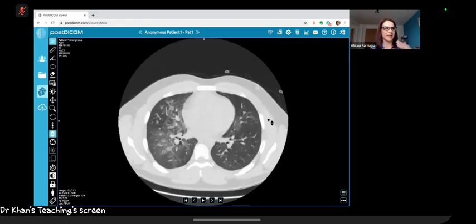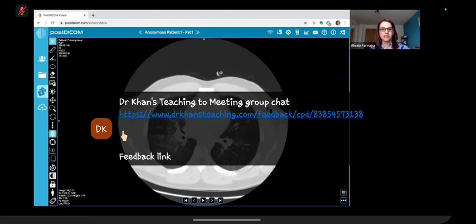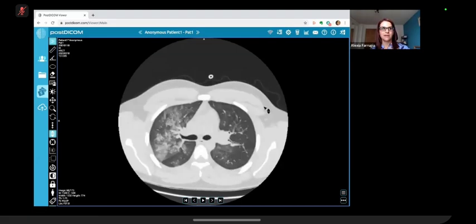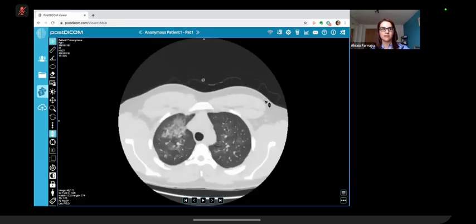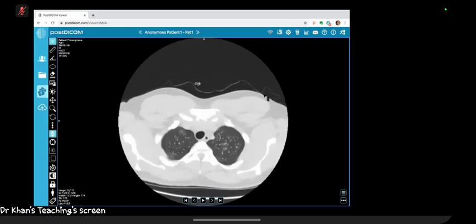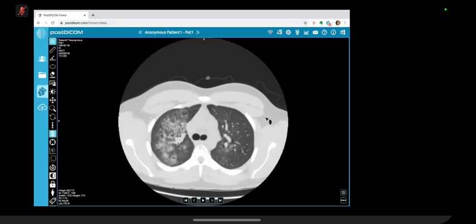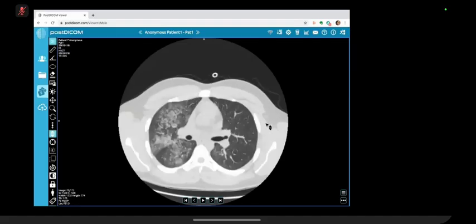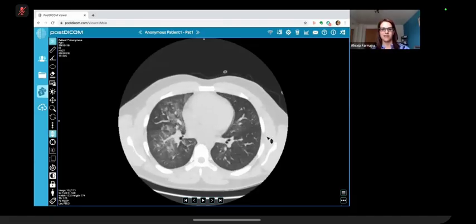Great. Okay. So this patient also had hemoptysis. Oh, in that case this can be a pulmonary hemorrhage, alveolar hemorrhage, because of the diffuse ground glass area, which could be diffusely showing as opacification on the right side. Great, great.